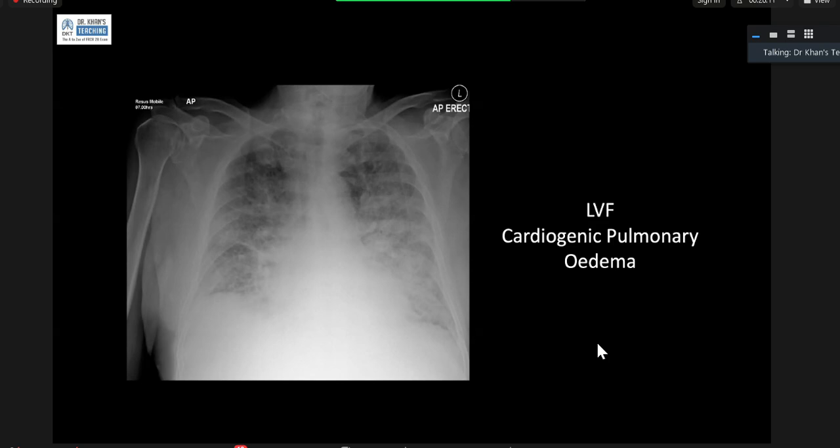The patient cannot take a deep breath in. We cannot center the patient. They may be rotated. The patient may be lying down or semi-recumbent. All these factors would affect the X-ray, okay? And these patients usually have an element of cardiac failure, and they also may have some infection. So it's very difficult to interpret an ITU X-ray with all technical factors suboptimal to say this is cardiac failure, this is consolidation. There might be an element of both.